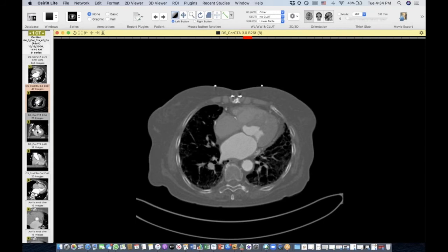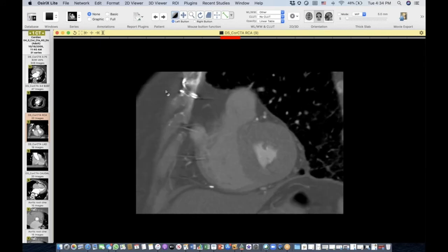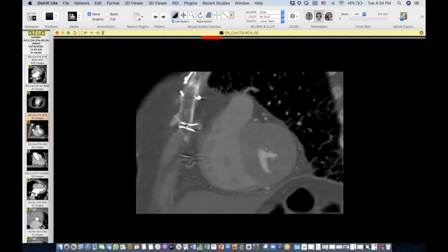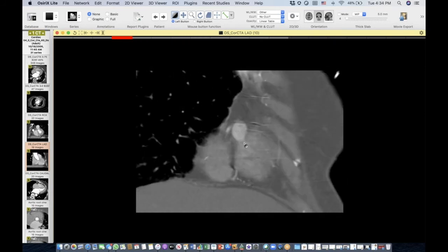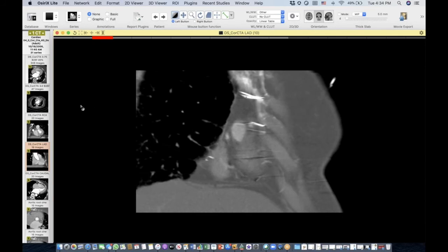This is a good view. Go ahead. Right ventricle. There's an outpouching of contrast next to the right ventricle, but it's near the sternotomy wires. So I'm wondering if it's a perforation or a pseudoaneurysm. Yeah, it's right here. Coronary? No, it's separate from the coronary, next to the right coronary. And right here, it seems to be communicating with the right ventricle, like you mentioned, right at the level of where the annuloplasty was performed.